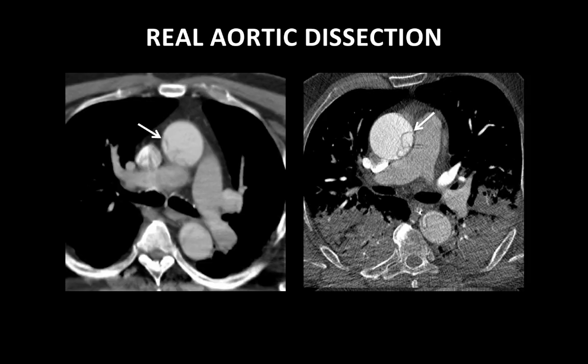And again, just to re-emphasize the differences between the cardiac motion artifact and a true aortic dissection, here are two more examples of aortic dissection involving the ascending aorta.